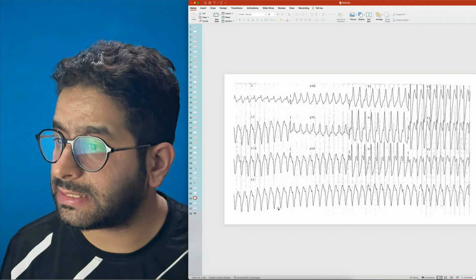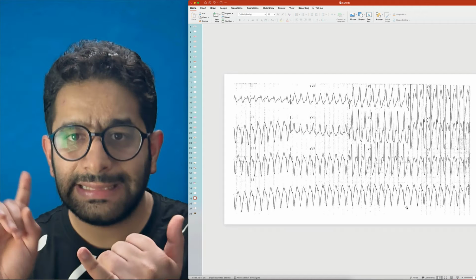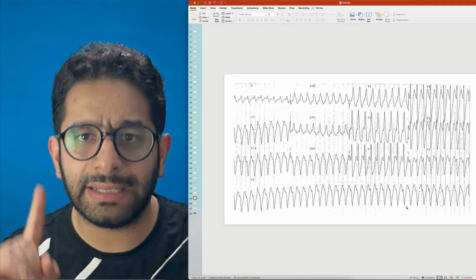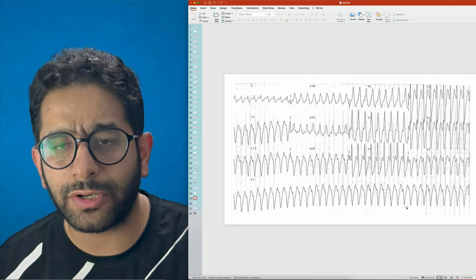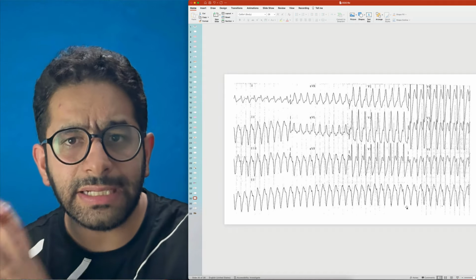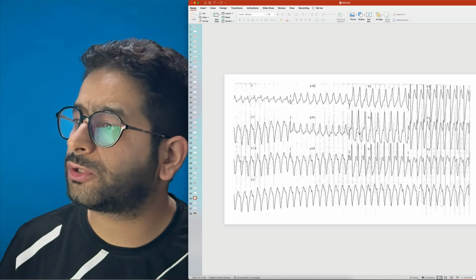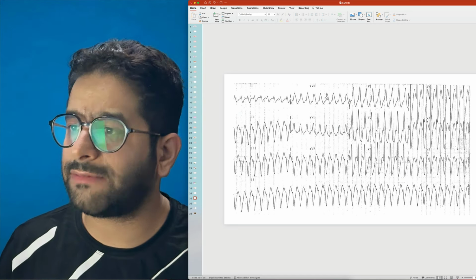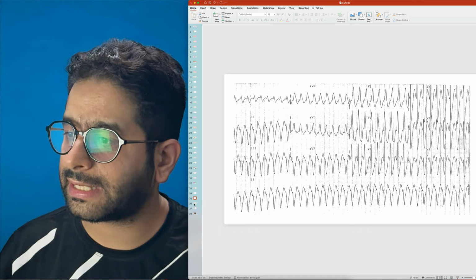The last ECG that we'll discuss is this ECG, wide complex tachycardia. Remember, tachycardia, narrow complex, regular, it's SVT. Tachycardia, narrow complex, irregular, it's atrial fibrillation. Tachycardia, wide complex, regular, most of the times it is VT. It is VT most of the times, okay? And another clue I told you was this aVR, which is positive. Extreme axis, aVR positive means northwest axis of an ECG. So this is ventricular tachycardia.